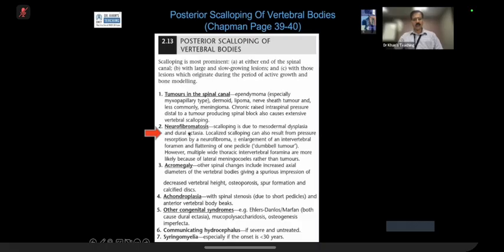And one of the key things in neurofibromatosis is that whenever you are in the exam, you say you will advise MR of the whole of the neural axis with contrast. Remember that. You must do that. Whole of the neural axis with contrast. They might show you or they might not show you, so that you pick up any tumors, both in the spine as well as in the brain.